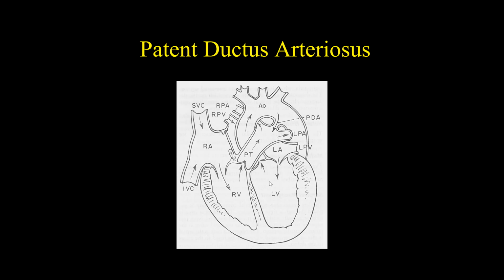So here's the left ventricle, okay, and here's the right ventricle. Between them is a muscular wall called the interventricular septum. And then this is the left ventricular free wall, and this is the right ventricular free wall, okay? Notice the left ventricular free wall is always going to be thicker than the right side in a normal animal. And that's because the left ventricle is the main pumping part of your heart, okay? So it gets worked a lot. And because it gets worked a lot, just like your muscle in your arm, if you worked it a lot, it becomes thicker. Okay, so the pressures in here are much higher than the pressures in here.